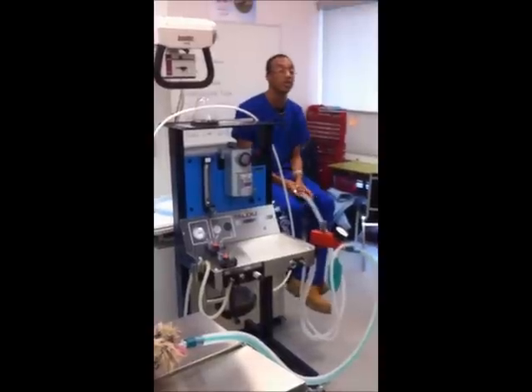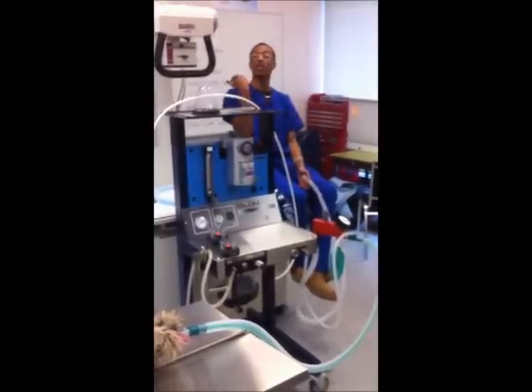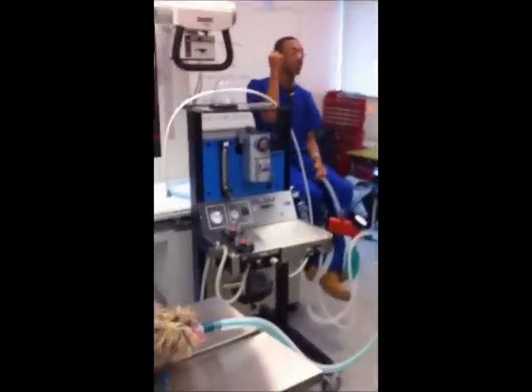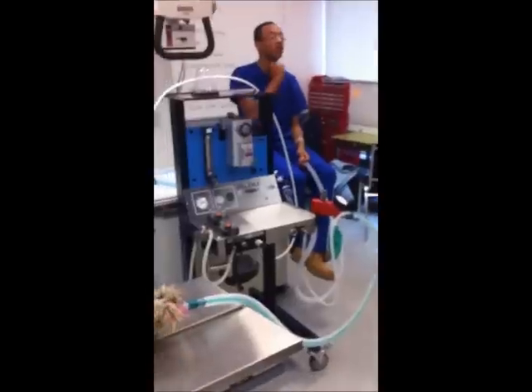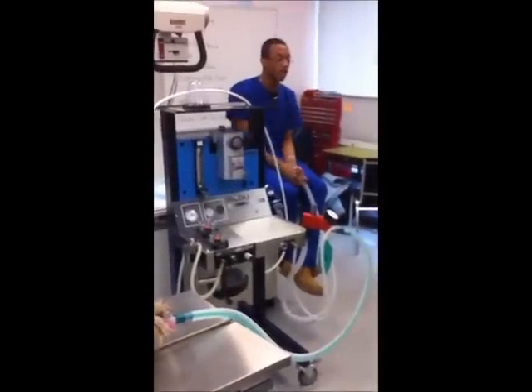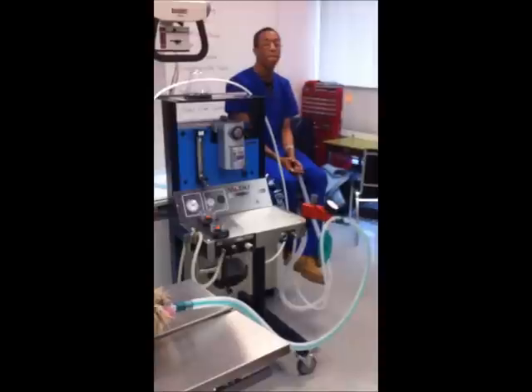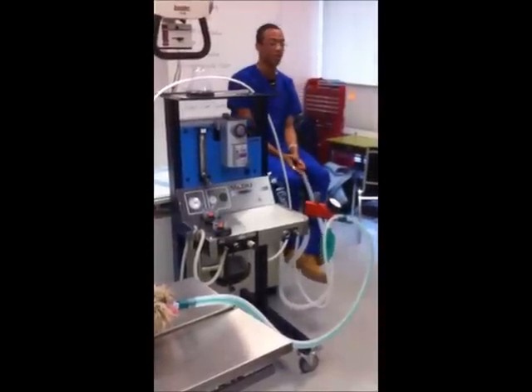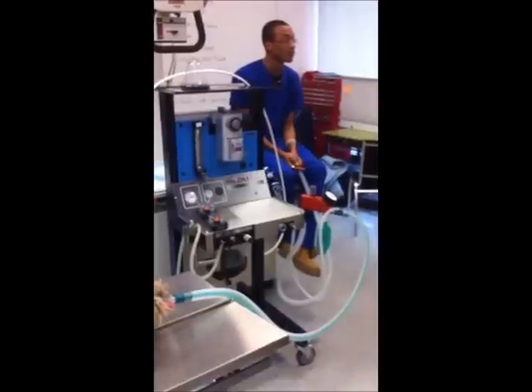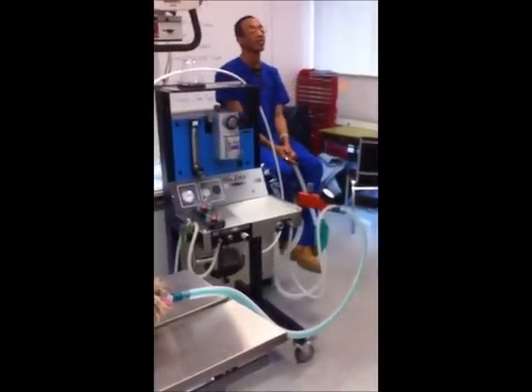From your inhalation hose, where does it go? Endotracheal tube. Patient breathes in, he's anesthetized, can't feel a thing. We're doing toe pinch, eye poking, tongue, jaw tone. He breathes out. Out the endotracheal tube, what's the next step for your waste gas? The exhalation hose. And then from your exhalation hose, what is the next step after that? The rebreathing bag.